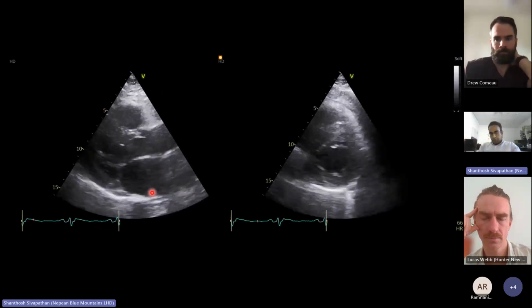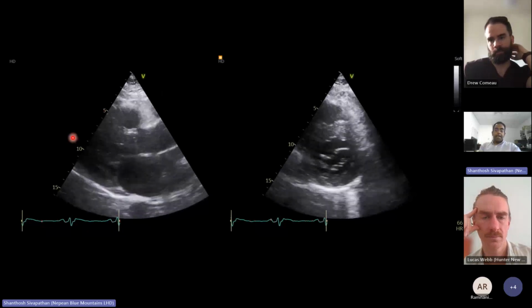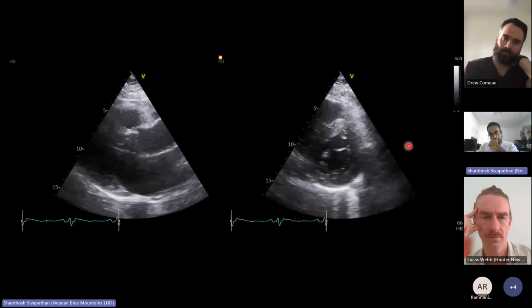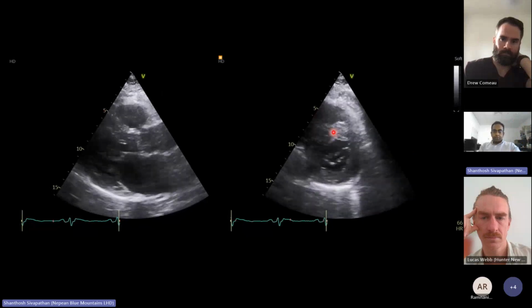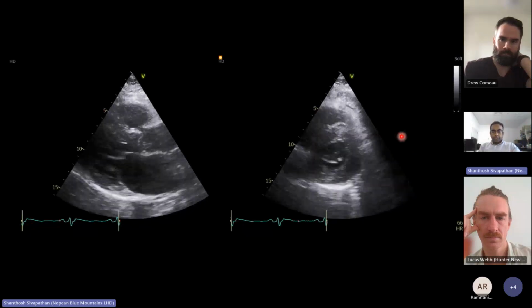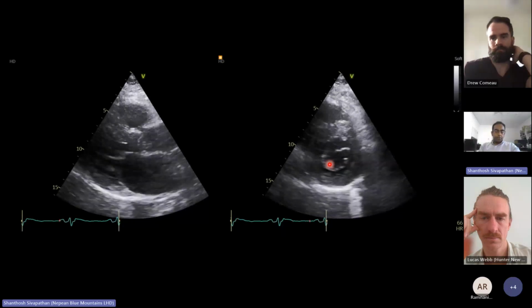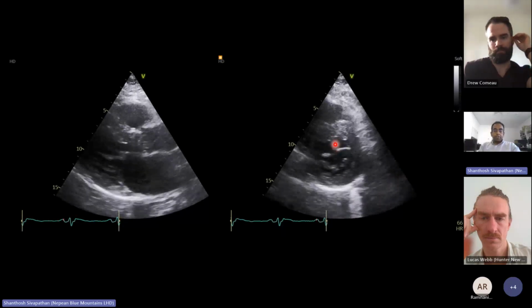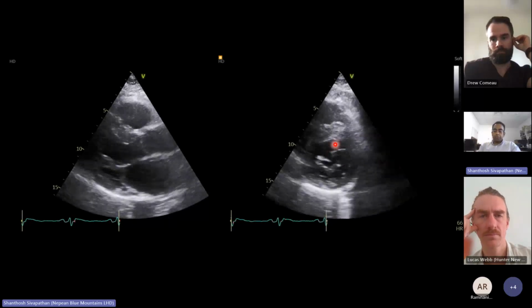That's how I would do it in DDU exams, or when you're doing your vivas or your presentations and your teachings. And then, say, looking at the short axis view, the anterior septal walls are hypokinetic. The remaining walls appear to be contracting well. The mitral valve appears to be opening and closing well. And I want you to get into the motion of practicing and just presenting it like that.